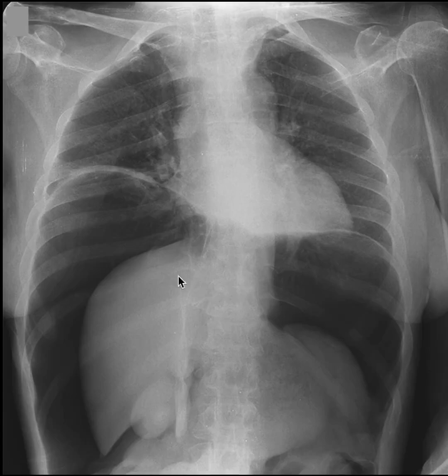Now, this is a massive amount of air, and it's a bad sign when you can outline the abdominal organs, like the liver that you see here, the gallbladder, the stomach. This is the spleen, and there's so much air here that it actually goes off the screen, out of our field of view here. So this is a true emergency. This is a subset of abdominal compartment syndrome.